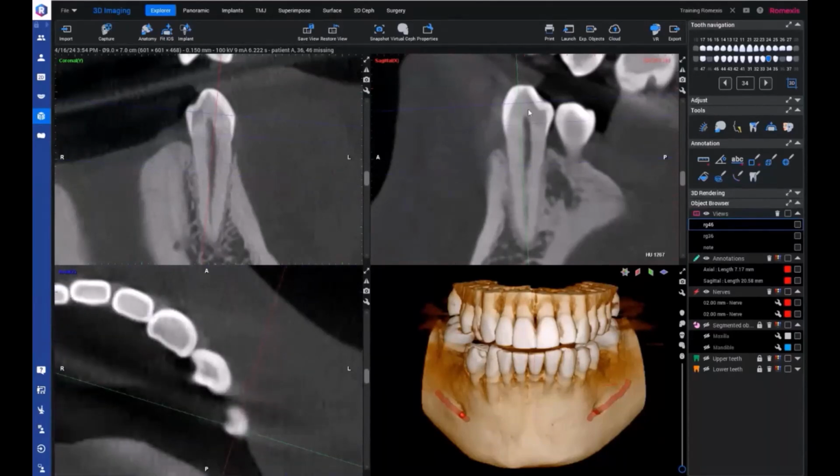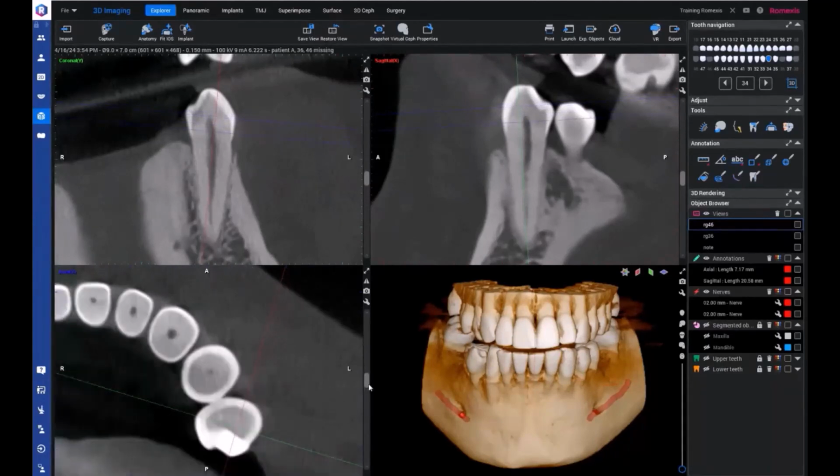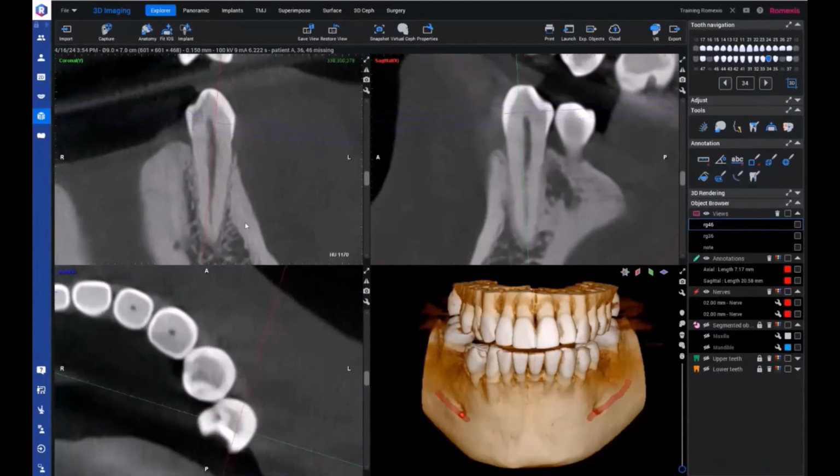And now you could draw it from any of these slice views, or you can even jump and start drawing it from one place and then continue with another slice view. But the idea is that, for example, now here I will bring the axial slice to here. And let's activate the tool, and then I can start clicking.